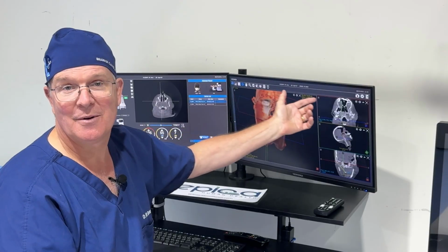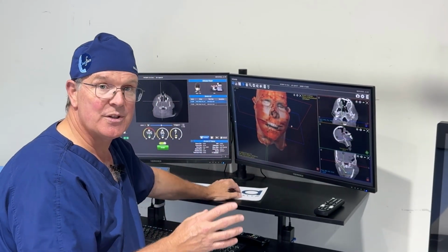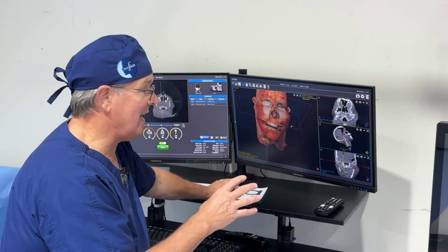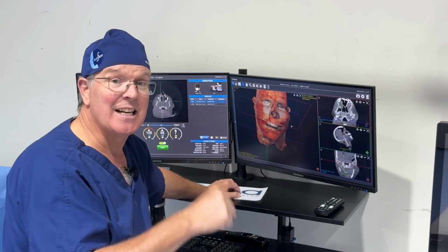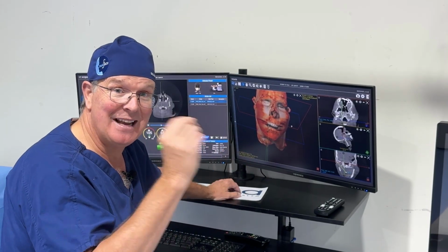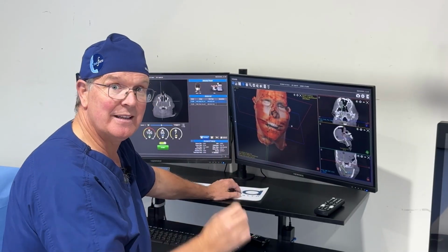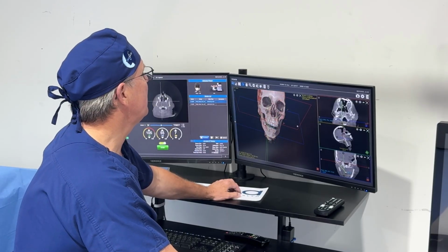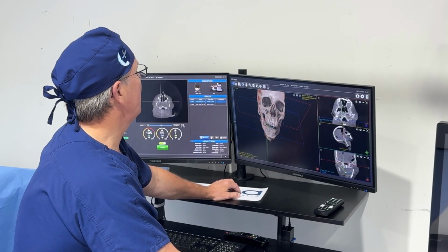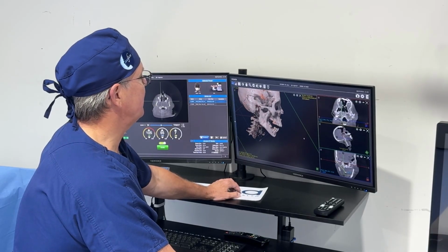It's just so incredible. The technology is fantastic, and the resource help that we've been able to access has just been unparalleled. Today is Monday, and on Sunday we were reaching out to them, and they were giving us IT help on this to help really get the most out of this technology. It was totally fascinating. So again, going back here, looking at this, this is fantastic.